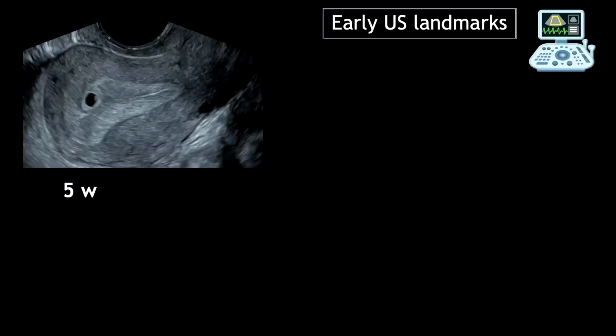But we're here doing ultrasound, so let's talk about the early ultrasound landmarks. The progression of sonographic findings is reproducible and it's predictable. Firstly, the fertilized egg implants itself into the decidua slightly eccentrically, and you see this little hypoechoic fluid collection with an echogenic rim that's slightly to the side of the endometrial echo here.